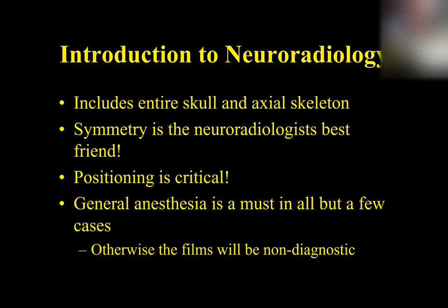Okay. So the first thing to keep in mind is symmetry is the best friend of a neuroradiologist. And by that, you have to keep in mind that film quality and positioning is super important. It's super important with anything you have to do with radiology. It's a garbage in, garbage out kind of thing. If you get crappy films that are overexposed and black, or underexposed and too white, or they're crooked, or not positioned well, or there's movement artifact from the dog panting, the radiographs look crappy, and it's hard to interpret them. Film quality and good positioning cannot be overstressed when we're talking about radiographs.